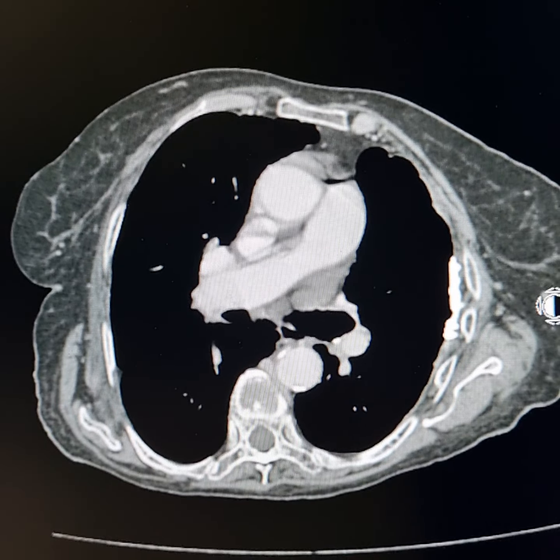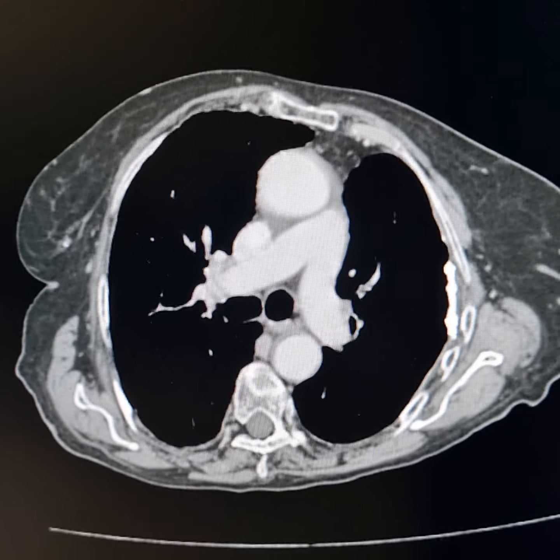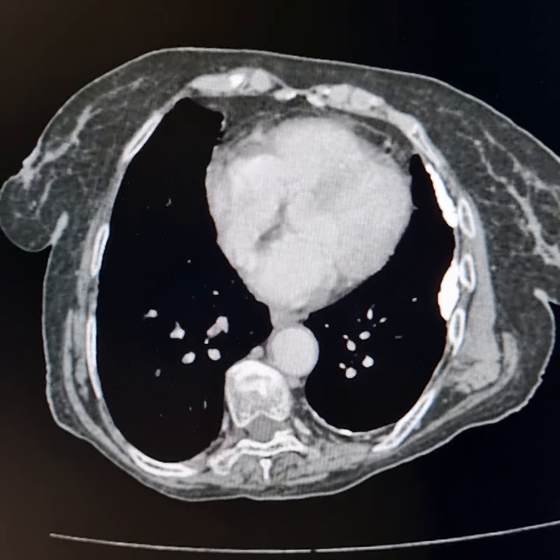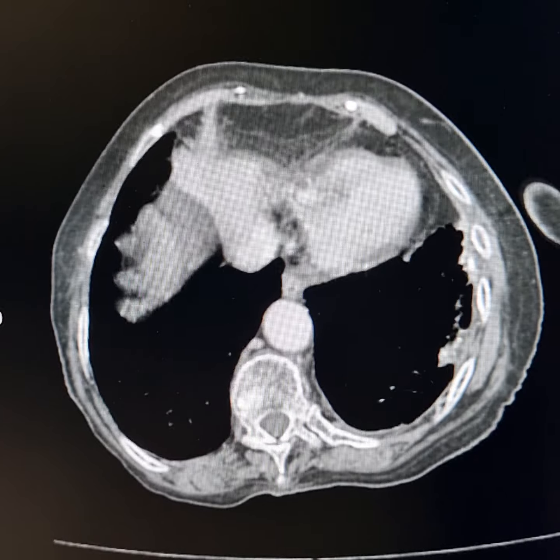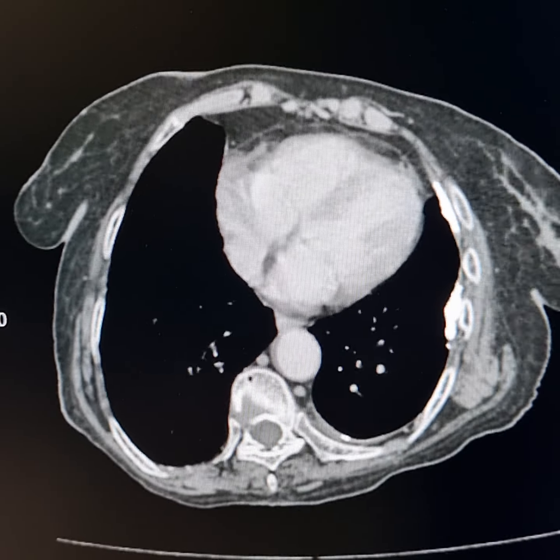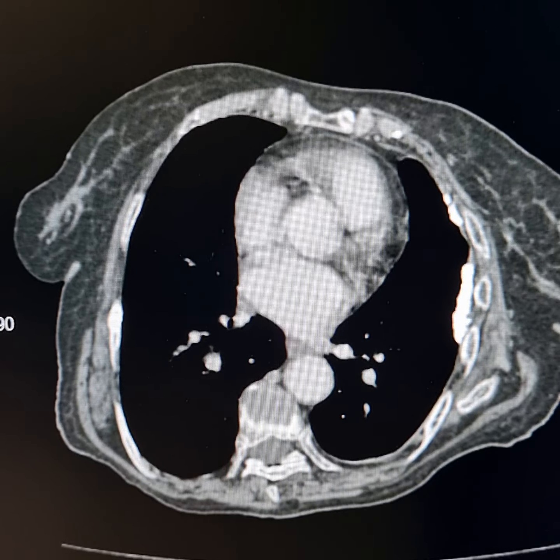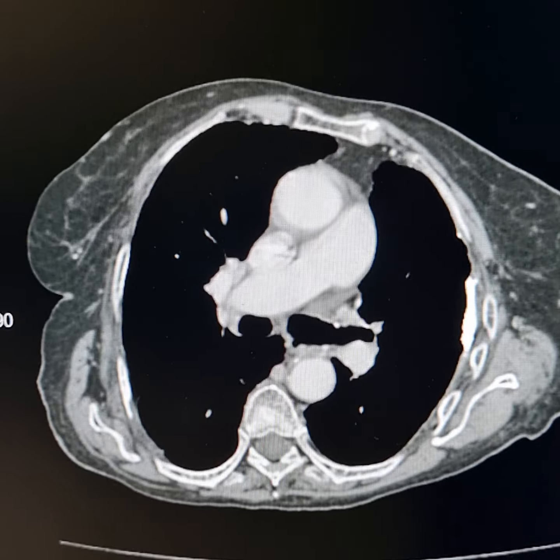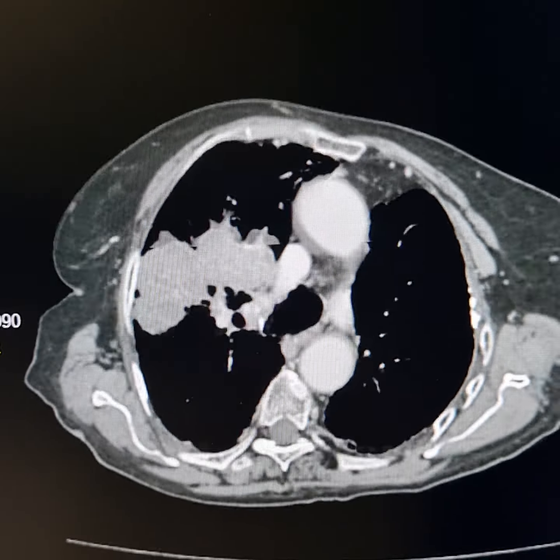Now, please see that these are the calcified pleural plaques along the left lateral chest wall as well as along the posterior chest wall. Now, these represent residual effects of previous pleural effusion of tuberculous etiology. These have made a cast of the left hemithorax in its lower part.